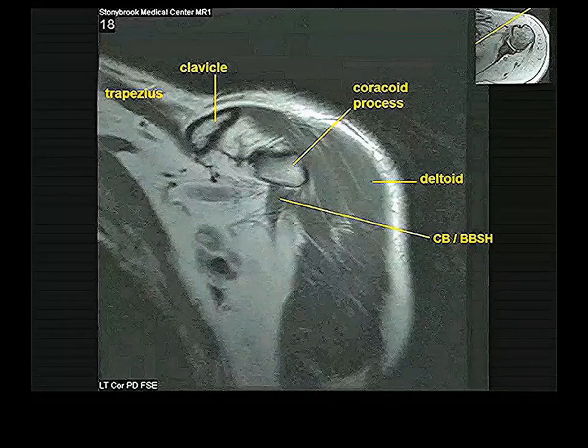So here is the plane of the section in an MRI in the scapular plane. I mean, it's never perfect. They never get these things in a perfect scapular plane, but they always aim to. They don't aim for a coronal plane. They don't aim for a sagittal plane. They aim for the scapular plane.